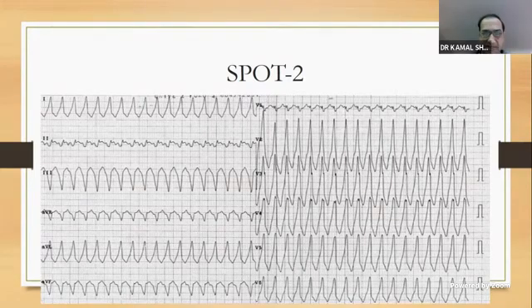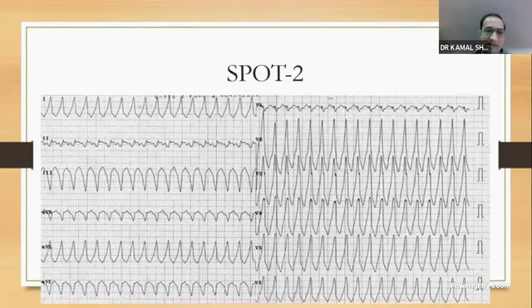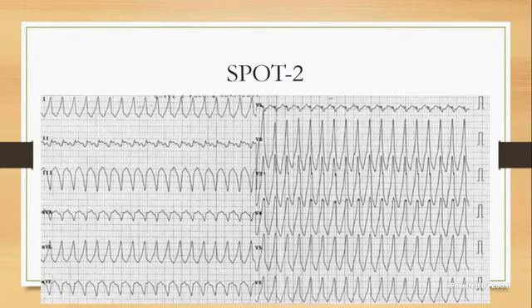Okay. And why do you say that? You're right. It's minus 30 because lead 2 is equiphasic, which is 60 degrees. Lead 2 is perpendicular, so it has to be 90 degrees. Lead 1 is positive, so it will be 60 minus 90, and you'll get minus 30. So you're right. It is not 60 plus 90, but it is 60 minus 90. So you're getting minus 30.